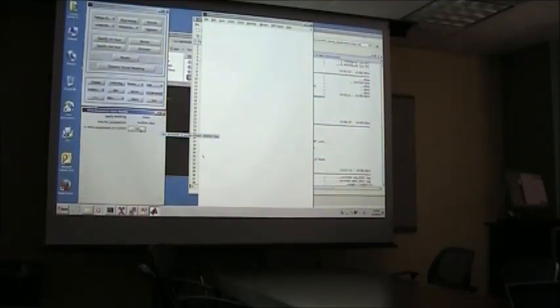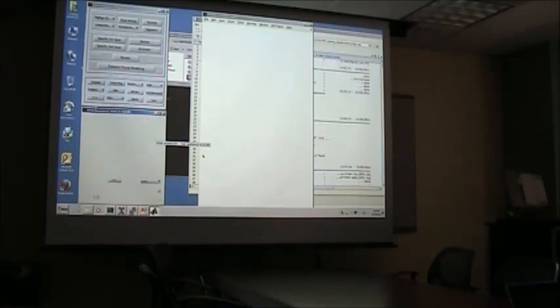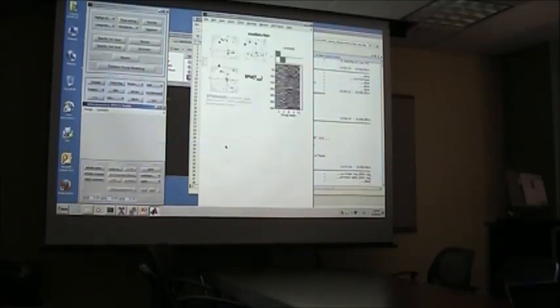And again, there would be all kinds of possibilities. I have no idea if it's actually going to elicit any activation. So let's see. Right, so I set up this contrast. I selected a threshold, which is not really relevant at the subject level, but just for demonstration. So here you end up with a bunch of blobs in the brain, where for this person, non-famous faces show stronger activation than famous faces.